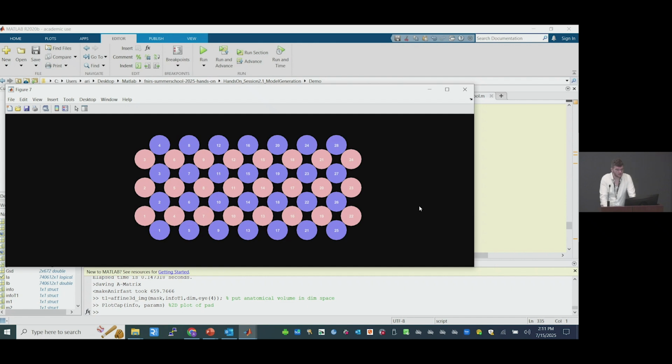Someone in the audience, give me a source detector pair that we should visualize. I'm going to choose, let's go Caitlin over there. 1 to 7, so that'll be source 1 and then detector 7 right here.